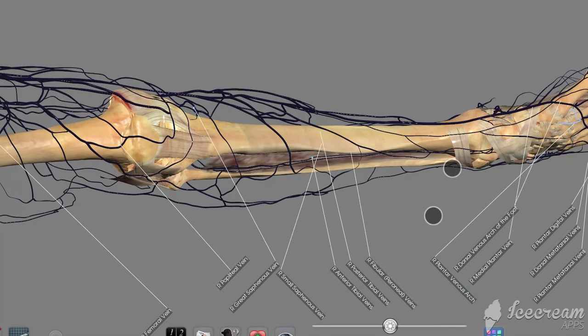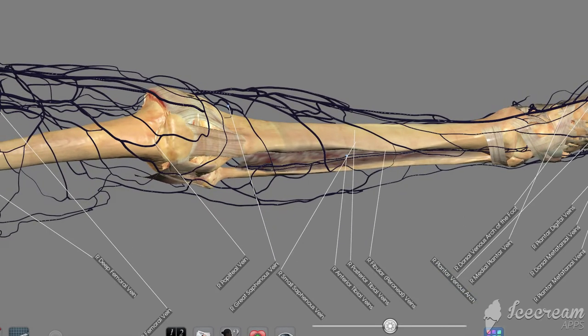So if we move our picture down a little bit, keeping everything sort of centered here, we get into the leg region. Remember, the leg or crural region has two bones, tibia and fibula. So we can see each one of those right here. And remember, the tibia is the larger bone that's found medial, and then the fibula is the smaller, more lateral bone.